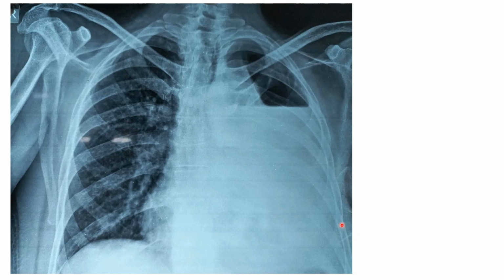So as of now, I think you should have a very thorough understanding of this X-ray. I repeat that there should be a straight line. Never miss this straight line in this X-ray. It should be through and through, and above it should be dark black and below it should be fluid, and the fluid should continue throughout the lung.